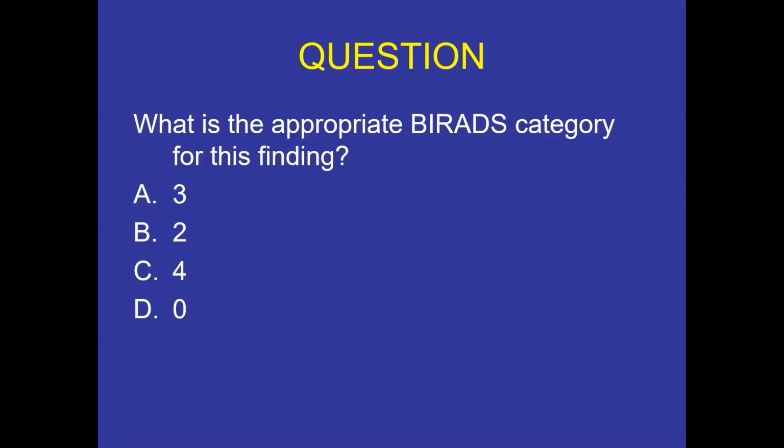You also have to make sure that these are really abnormal lymph nodes, because the way to best evaluate axillary lymph nodes is by ultrasound, not mammo. Sometimes we can see lymph nodes on mammo that look prominent, and we do the ultrasound and they're actually normal. So you always want to do an ultrasound.